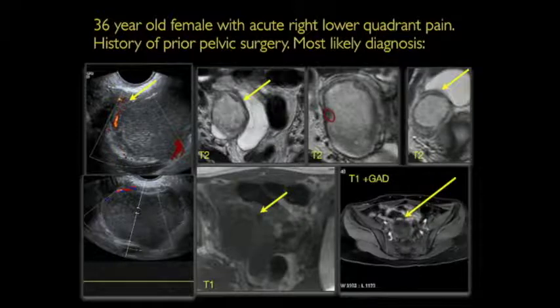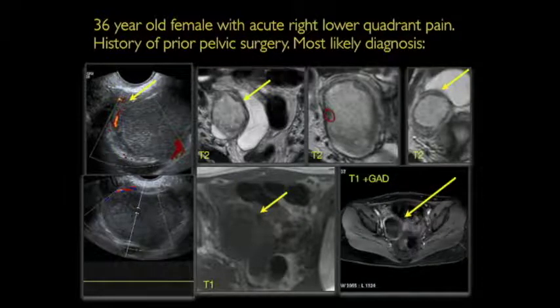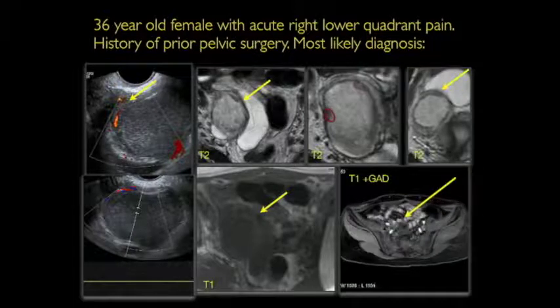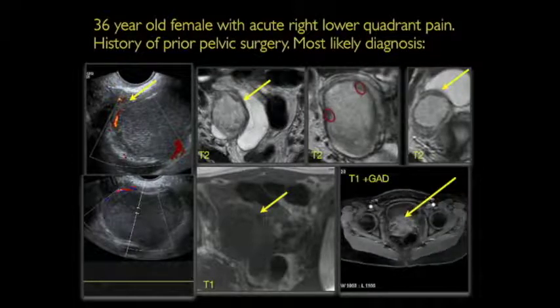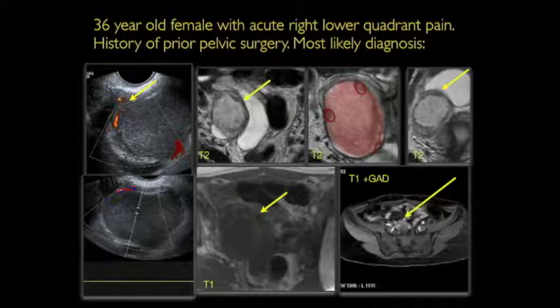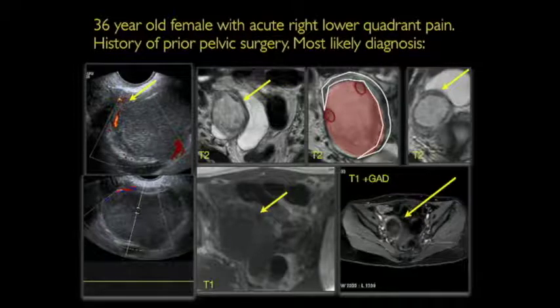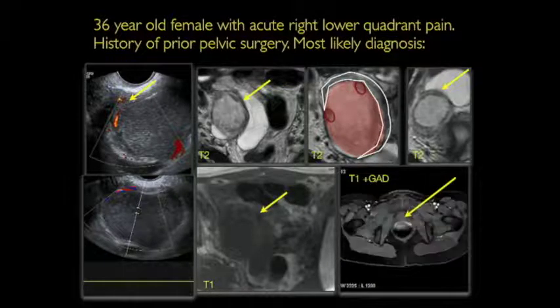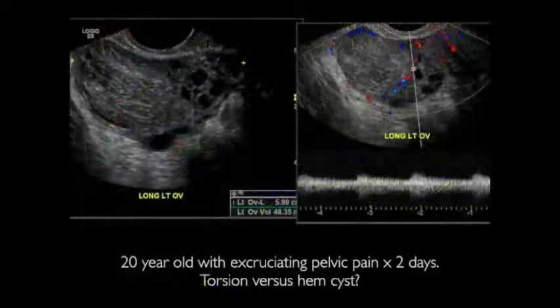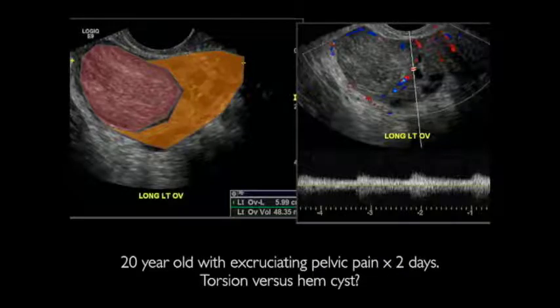Other subtle things you could see really beautifully on this MR: you see the one dominant follicle, which has hemorrhaged. It has these little follicles in the periphery because it pushes the others aside, and that's the hemorrhagic cyst, and then that stretched ovarian parenchyma. So these are the key findings when you're looking at both MR and ultrasound. And here's a little bit easier example. Here's the hemorrhagic cyst and a beautiful claw sign from the ovary dealing with the hemorrhagic cyst.